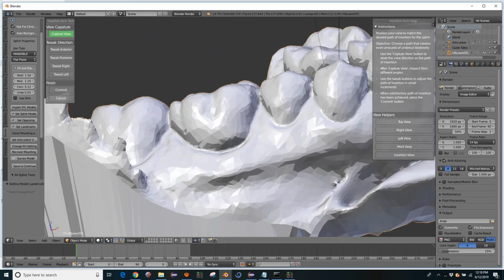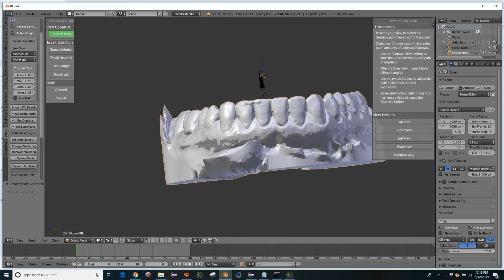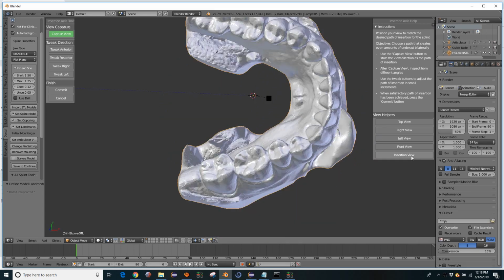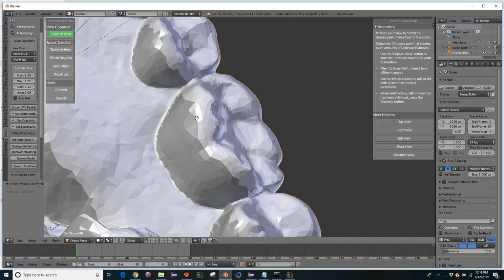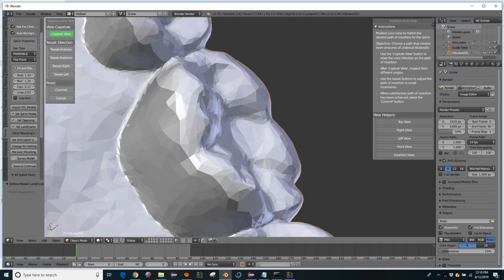And faces that are pointed even a little bit away from it, we shade in dark, and faces that have any component with their normal pointing towards the view direction, we shade light. Okay. Then what we do after that is you go through and you test every edge and say, okay, are your neighbors both facing towards or both facing away, or do you have one on each side?